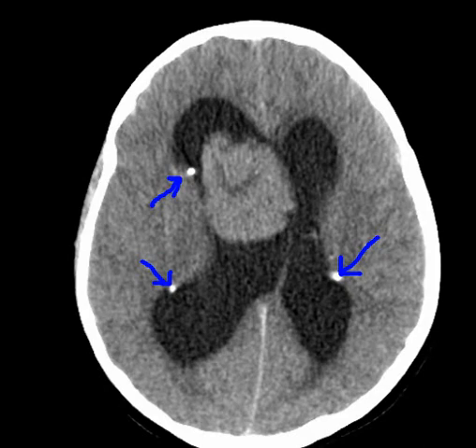So whenever you diagnose a case of tuberous sclerosis, please look at the foramen of Munro. There can be a subtle small enhancing mass which could represent a SEGA. It is very important to look at images in the exam, and whenever you diagnose this case, also look for the associated findings in the lungs. Suggest HRCT to look for LAM, suggest echocardiogram to look for rhabdomyoma, as well as suggest ultrasound abdomen to rule out angiomyolipomas. These are the associations of tuberous sclerosis.